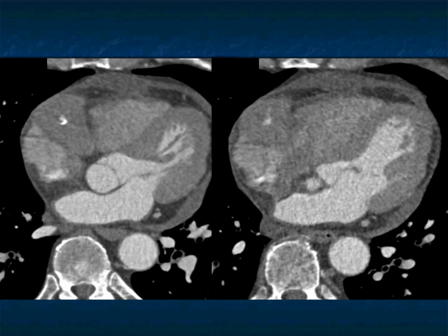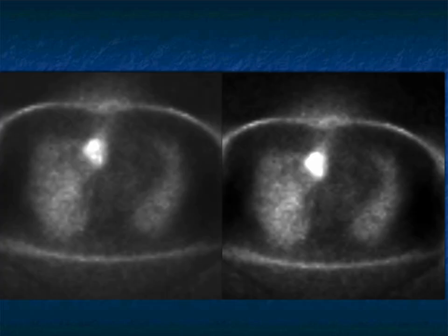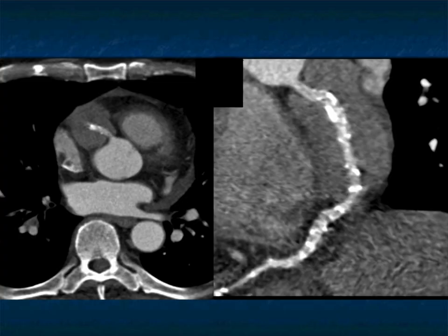Usually with angiosarcoma, it involves the right atrium and there's direct extension and maybe secondarily compressing or involving the coronary artery, but usually it displaces it, not encasing it. I would think about lymphoma in this case because anytime I think about anything infiltrating, I'm always thinking about lymphoma, and there is some pericardial thickening or fluid. Whatever it is, malignant and really hot on the PET scan.